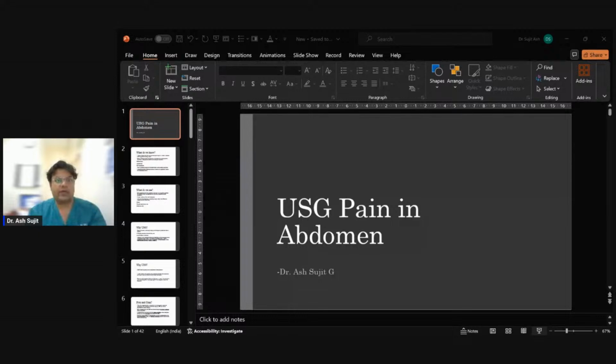Now, what happens when the fluid in any of the non-dominant follicles fails to be reabsorbed? That continues to grow. This is what we term a follicular cyst. In ultrasound, follicular cysts are thin walled, avascular and mostly unilocular, and contain anechoic fluid, resulting in posterior acoustic enhancement. This is what you look out for: thin walled, avascular, unilocular. The other part is a little confusing if you're not doing sonography regularly, but these two, three things you can remember. And they can become large.